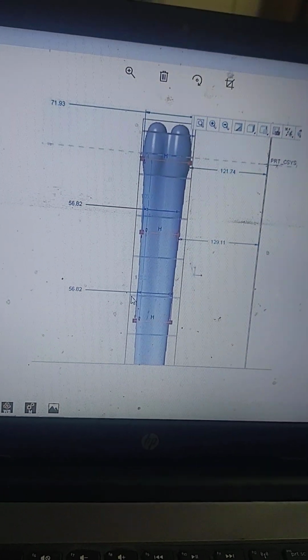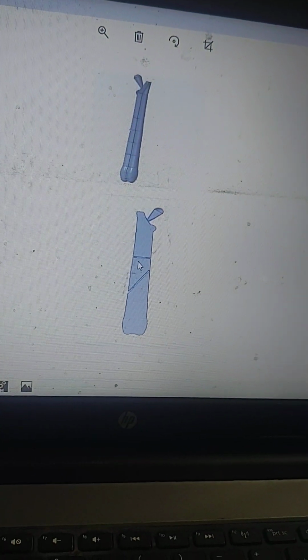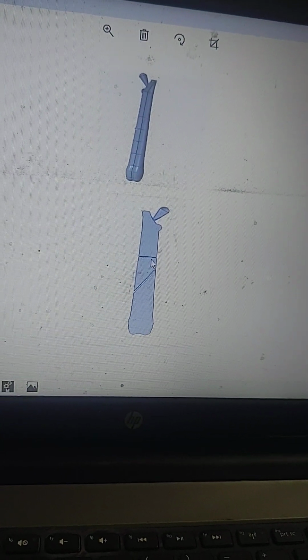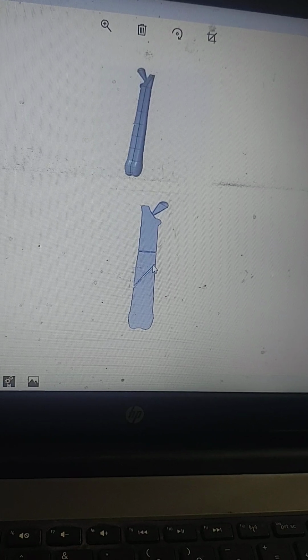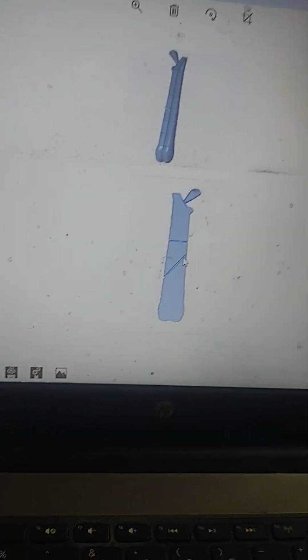So this is the femur bone, this is the femoral condyles, and the femoral shaft. Actually, the femur bone is broken in this way. You can see the two cuts here. One cut is horizontal and one is inclined at a 45-degree angle. So this is a major accident, maybe a motor vehicle accident or any other, that broke the femur into two parts.